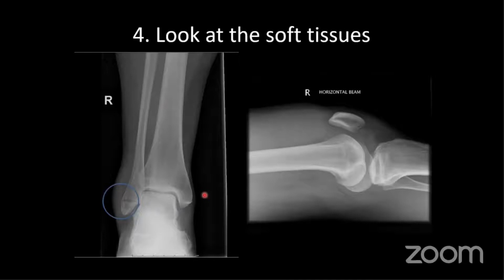Yep. So we've got a few answers coming in. One person said effusion, which is spot on. Someone also said suprapatellar bursitis. So this is the knee effusion. Normally you should see the patella tendon very clearly defined, and this shouldn't be edematous down here.